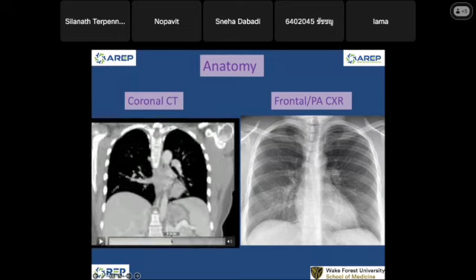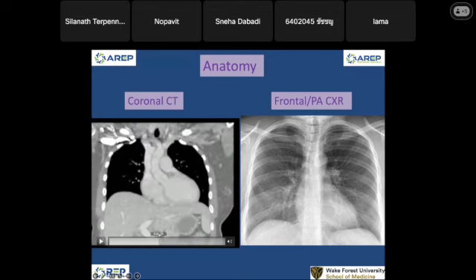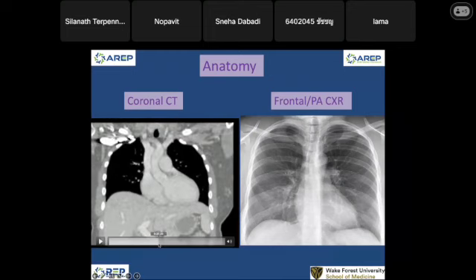Okay, so we're done with the soft tissue and the bone. Now we're going to go further into the chest. We're going to see the contrast we injected. This is CT chest with contrast. So you start seeing bright contrast in the vascular structures and the heart here. We injected the contrast from the right upper extremity, and the contrast comes through here. So it's going into the subclavian vein, and then right there.